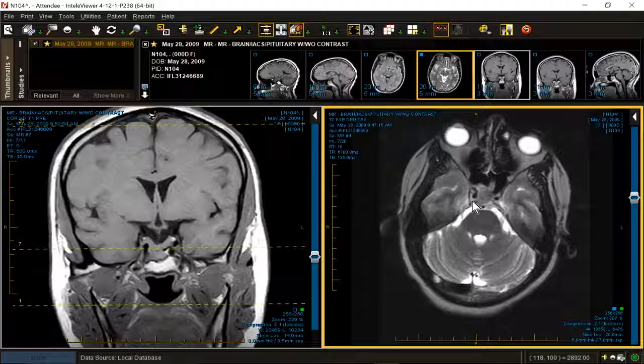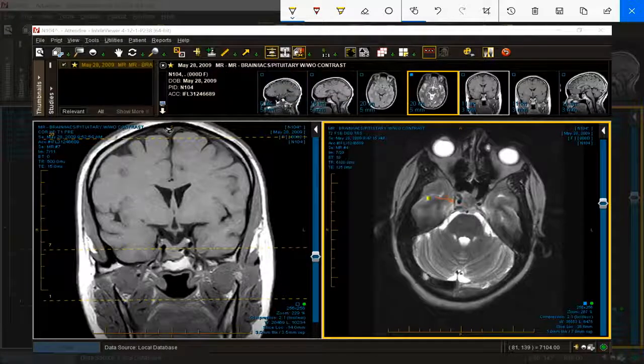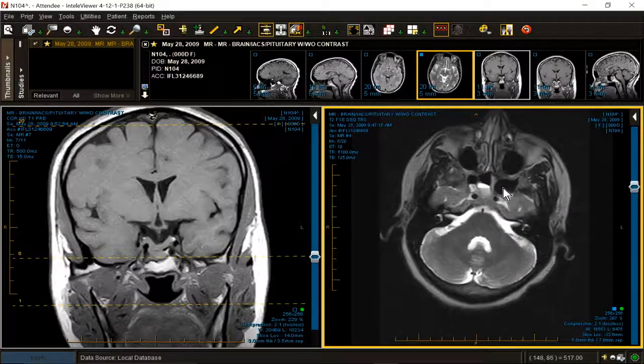There is the abutment of the lateral dural sinus wall. A fourth sign is bowing of the lateral dural venous sinus wall. We absolutely have it right here. Don't be distracted by this pacchionian granulation in the back. So I think that helps confirm the diagnosis of cavernous sinus invasion.